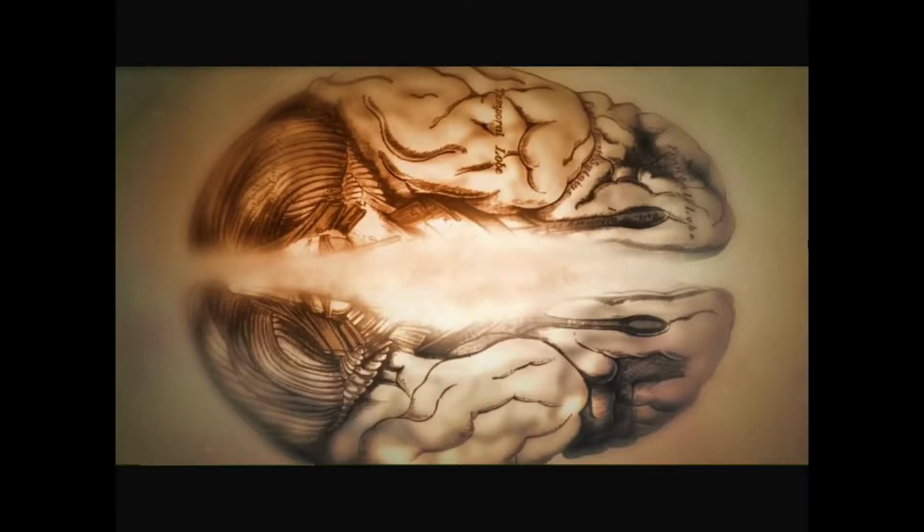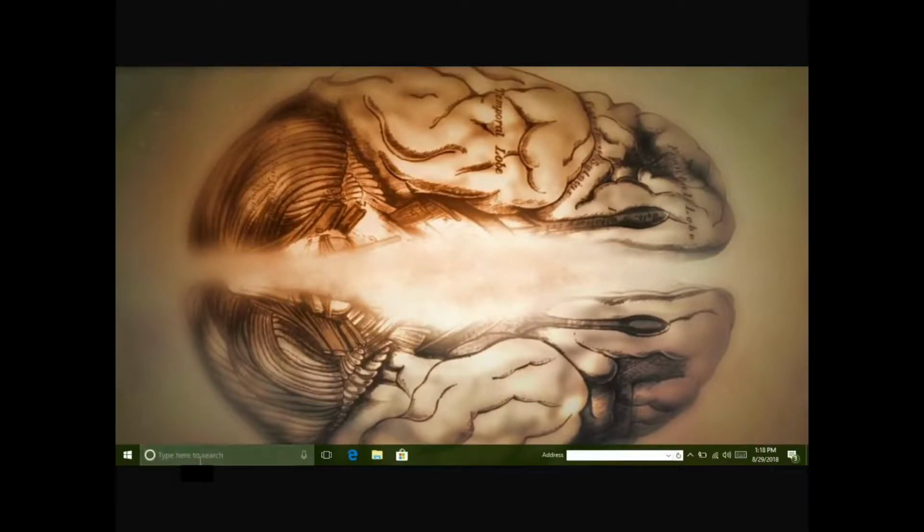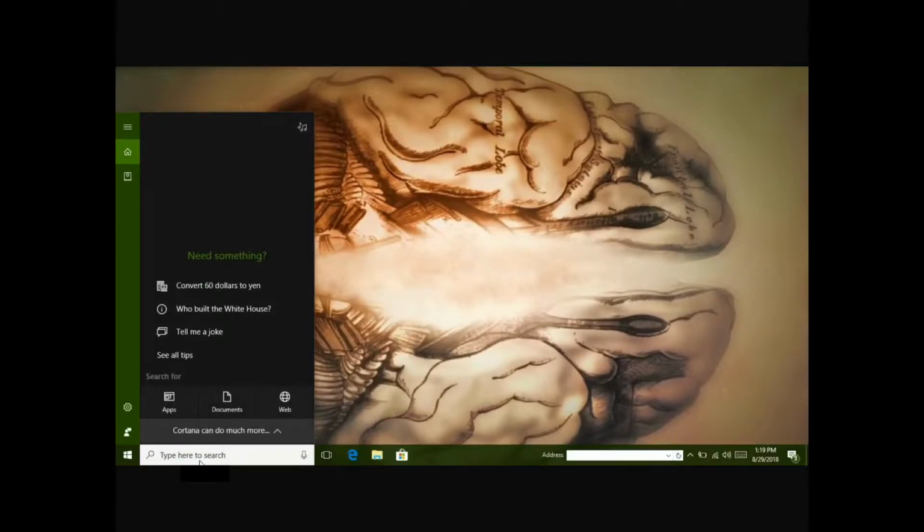Hi, my name is Juan Vasquez, and today I'm going to take you through a quick tutorial on ITK-Snap and how to use it. So the first thing that we are going to do is open ITK-Snap.